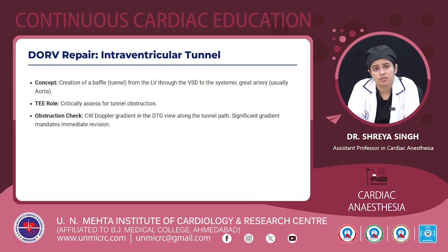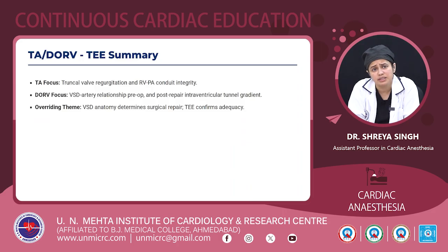So there's a creation of a baffle, a tunnel from the LV through the VSD to the systemic great artery, which is the aorta. And then the role of TEE is to critically assess for tunnel obstruction. Continuous wave Doppler gradient in the deep transgastric view can be used along the tunnel path, and any significant gradient mandates immediate revision.